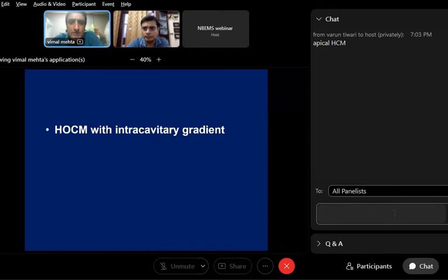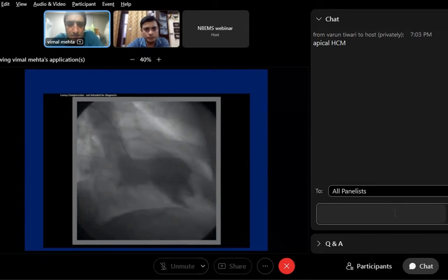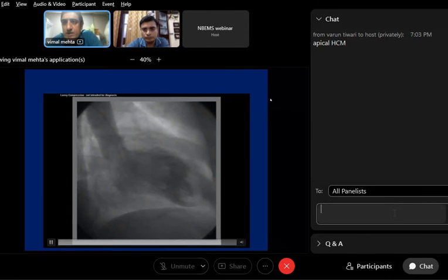So this is all about it. What about this one? Post MR won't increase, somebody is saying on the chat box. But post PVC MR, see, what happens is, if you induce a VPC, the ventricle may contract when the valve is closed. So those kinds of things can occur.